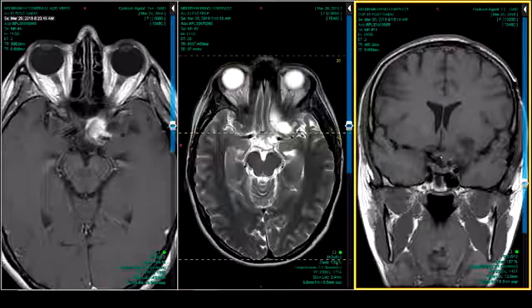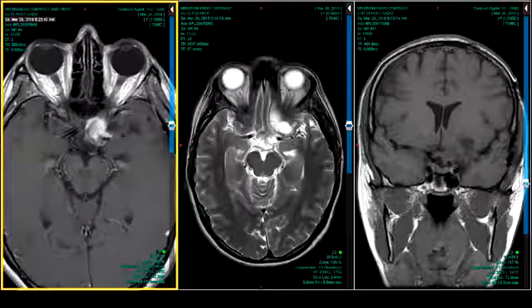The NF1s are more likely to involve the intraorbital optic nerve, and the non-NF1 optic apparatus ones do worse. Okay, so if you can look at it and say, well, this patient doesn't have NF1, well, that may very well be true. Particularly true if it's not involving the intraorbital optic nerve, but the chiasm and optic apparatus.